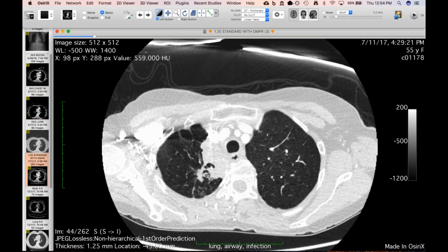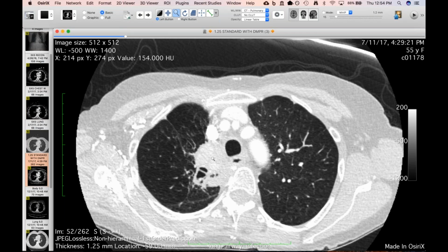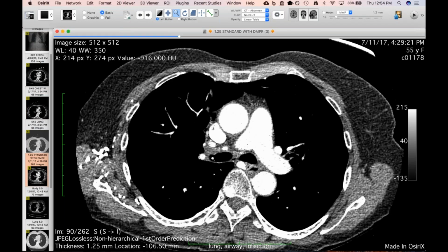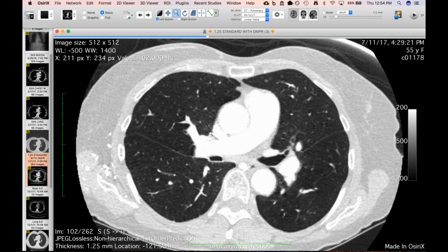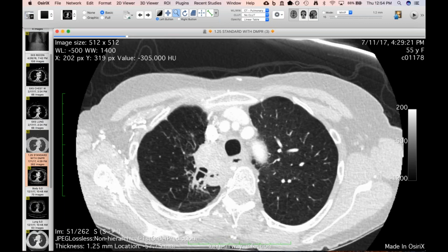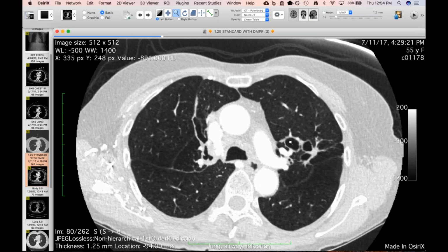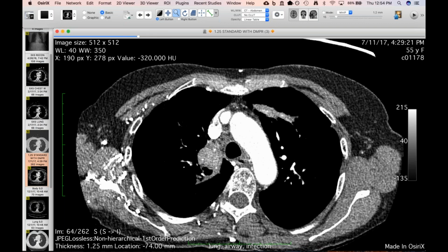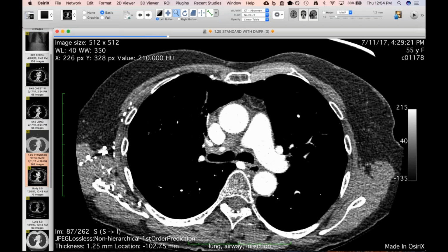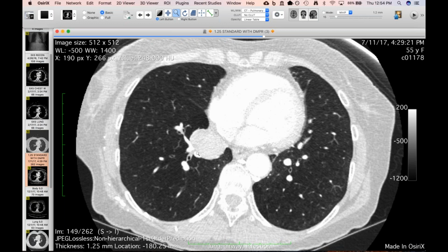And then she was finally referred, and this is when I saw her, this study. And of course, looking at the other studies, and seeing, especially in the older studies, how it looked like it was all just high attenuation mucus, I called up the interventional pulmonologist and asked him if this lady had a history of asthma or if she had been diagnosed with ABPA, because that's what I was thinking this was. And I said, given that it's more mass-like, it could even be along the bronchocentric granulomatosis spectrum of things, which can sometimes mimic cancer.